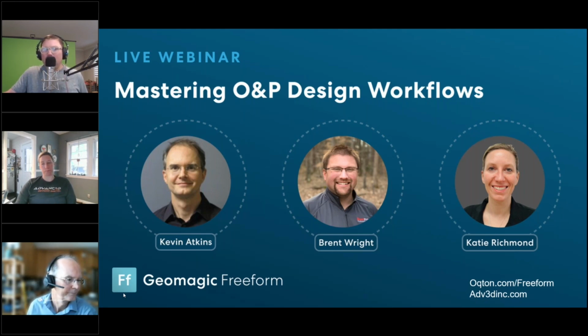So I would say this is more of an advanced thing, and for most people, it's not going to make a massive difference, but for those that are actually waiting for files to transfer onto their printer and slice on their printer, they will love you when these files are much smaller. What I've found is, if I can keep them under 20 megs, I don't lose any resolution unless I'm doing lattice structures, 3D lattice structures. I don't get the pixelation. So if I can stay under 20 megs, I keep the technician that runs the printers happy. I keep my slicer happy if I'm doing FDM, and everything's well.